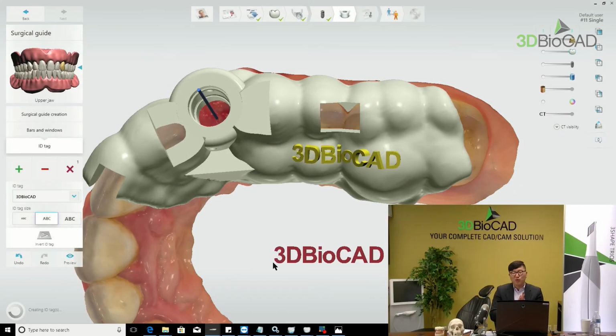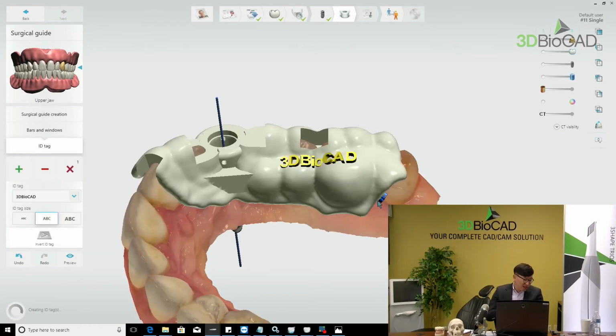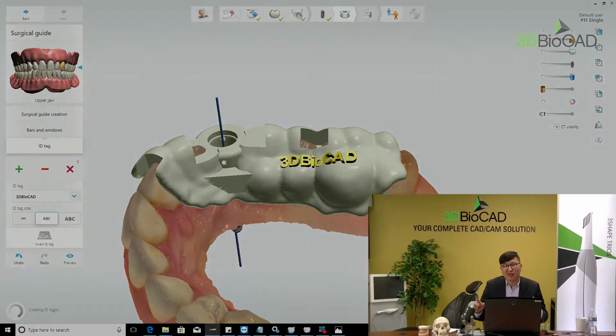Okay, so the important part is actually after the surgical guide. Okay, we know we are good. I have a printer, I can print it myself. I can put the sleeve in and then put a little bit of glue or resin in. No problem to make a surgical guide. So how can we make the immediate temporary crown together with the surgical guide? My answer is like this.